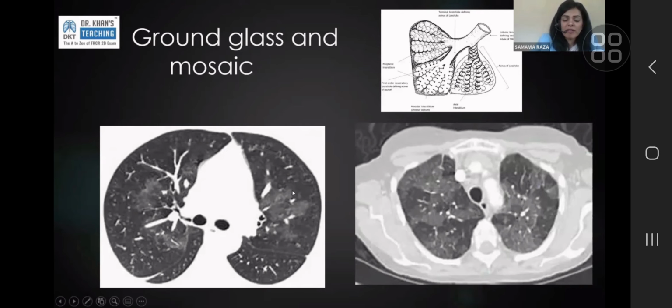When you have ground glass change, the thing to notice is, is the lung next to it normal? So in this one, if you think that the ground glass is abnormal, you have to look at the lung next to it. Is the black too black, or is the black normal lung? In most cases, it will be normal lung. In some cases, the black will be too black and the white will be too white. That very starkly different attenuation between parenchyma next to each other can be very striking to look at. And that is what is typically described as mosaic attenuation.